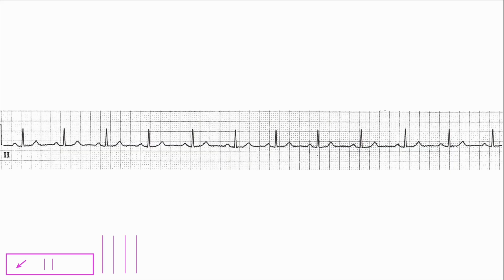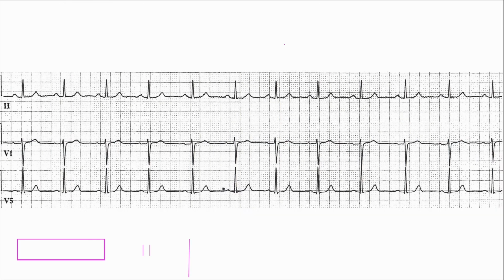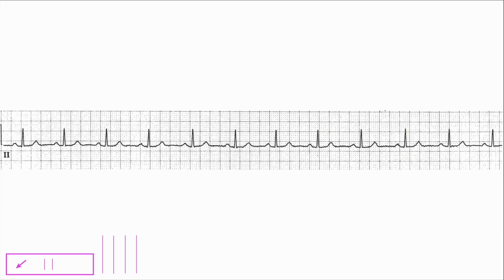So today we're going to be taking a look at this 12-lead ECG. Now there's this exact same version of this ECG as a rapid ECG interpretation, so very brief with virtually little or no explanation. This deep dive is exactly what it sounds like. We're going to be breaking down what we're doing, how we're doing, why we're doing this.